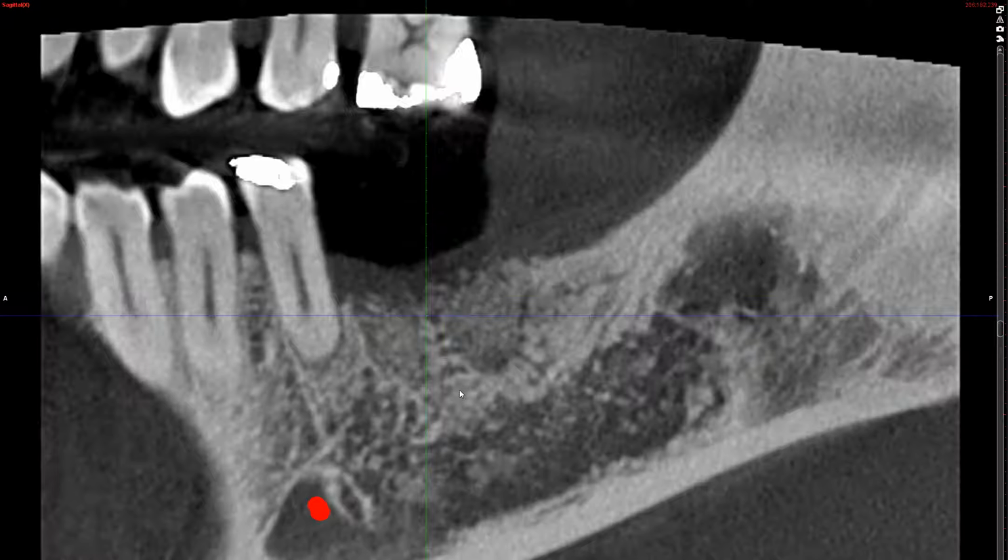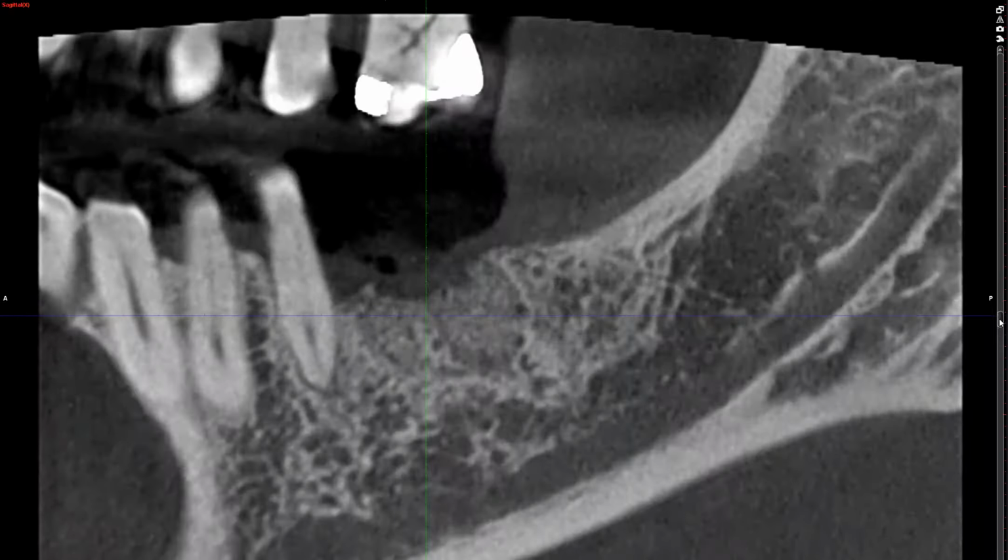By now, just from periapical radiographs, you know that there are some characteristic trabecular patterns depending on which area of the mouth, which area of the arch you're imaging. But you see that for graft material, there is no pattern. It's just heterogeneous radiopacities. You can almost visualize that the material is being packed into this distal socket and the mesial socket. Okay, so having said that, let's look at the crest one more time.